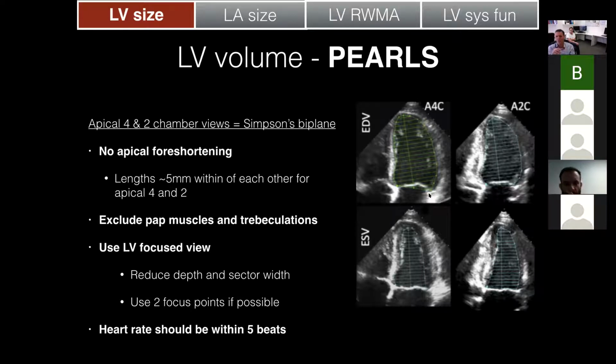So it's like driving a car, right? If you're driving a car, you don't look at the end of your bonnet when you're going around the corner. You look at the corner and the car follows you. So get your cursor to follow your eyes. Look ahead to where you want your cursor to be, not at your cursor. So I don't know if you've got any other tips and tricks.